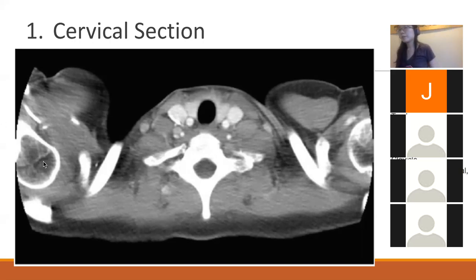The reason why there's this brown space in the middle is because I think in block 1 you guys learned about the difference between cortical and trabecular bone. So this is the hard outer cortical layer, and then on the inside you have the spongy trabecular bone.